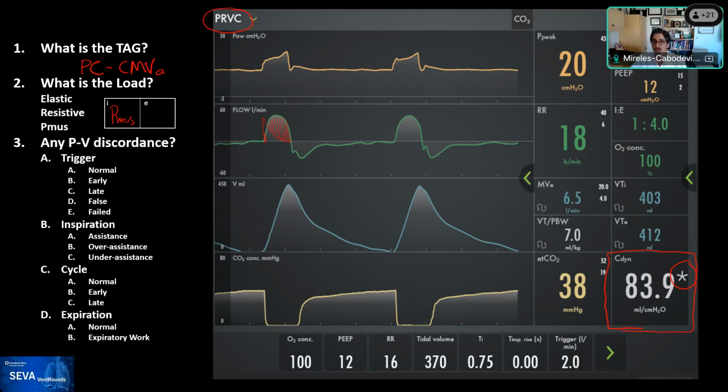Yeah, so for the amount of pressure that it's giving, in this case, the patient is on a PEEP of 12, and I presume that the inspiratory pressure is around, I don't know, 5 or 6, so 15, 16, because the peak pressure is not what the patient is getting. I would say that the pressure that the ventilator is giving is around, I don't know, 6 mLs per kilo for the amount of tidal volume. That's where these very large values are coming from.